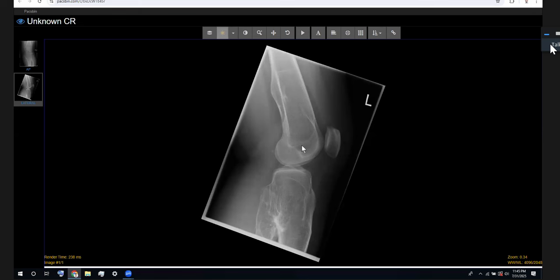So besides the new pain and the X-ray changes, what else would make you think that there's malignant transformation? If the patient complains of a new site swelling or any fresh symptoms, that would also be suspicious. So what would you ask for if that was the case? Then imaging, I would do an MRI to assess the cartilage.